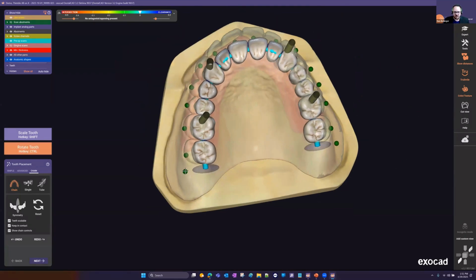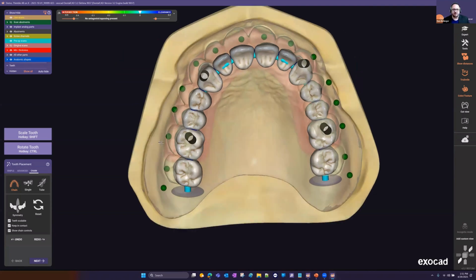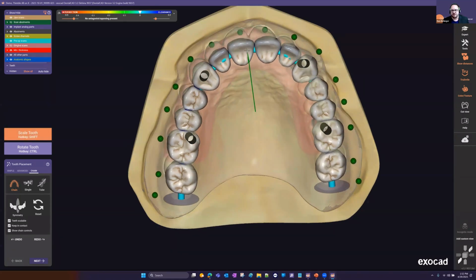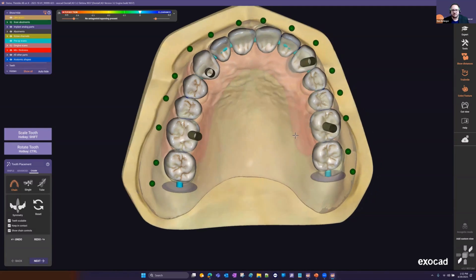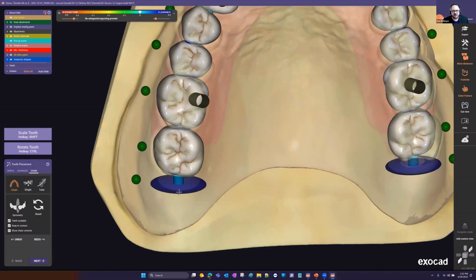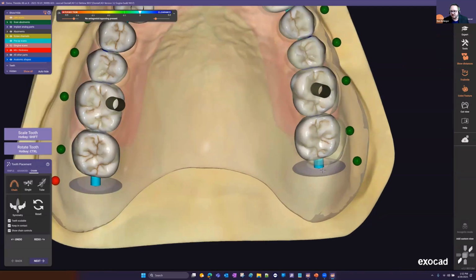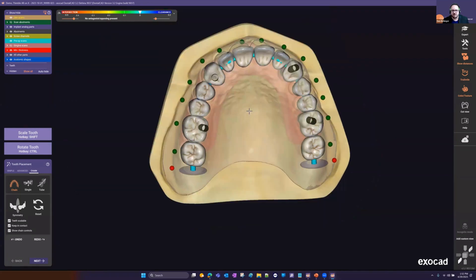So a couple of things: if you unlock them all, I hold control and shift and left click on the points to toggle all the points to be unlocked. You can actually scale the whole arch at this point. This is a quick, easy way to get things in the ballpark first, and then from there, another method I like to do is get these control discs as distal as I want to be with my design, and then lock it in place.